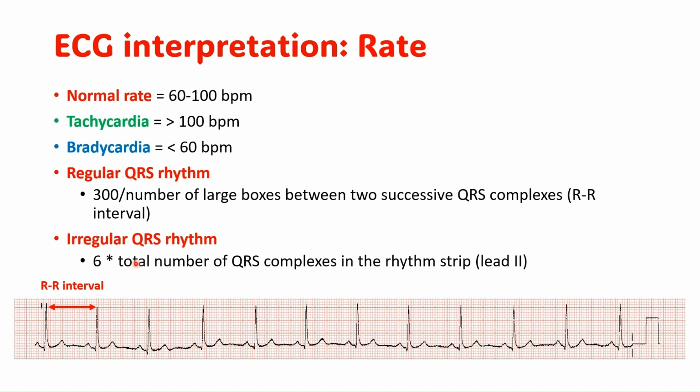Okay. And the methods I've just mentioned of determining ventricular rate, atrial rate can also be calculated by doing the same for the P waves. And atrial fibrillation is a good example where atrial rate and ventricular rate can significantly vary, because atrial rate can be anywhere greater than 300 beats per minute, and the corresponding ventricular rate can be slow because you can have slow AF, or it can be very, very fast, typically in young people.